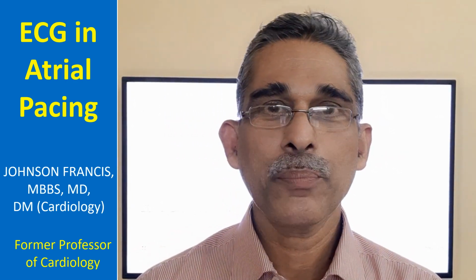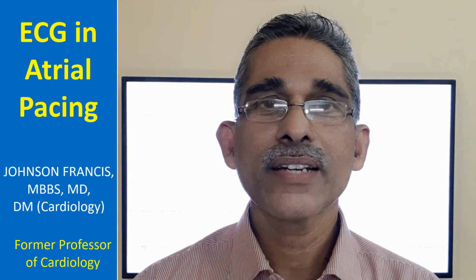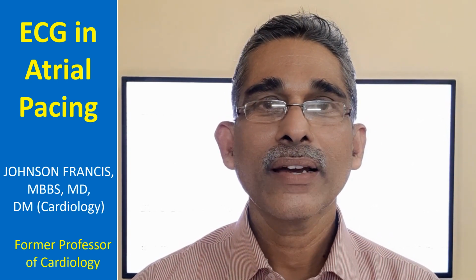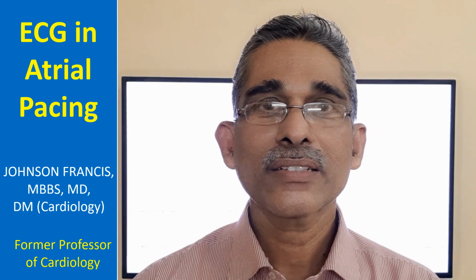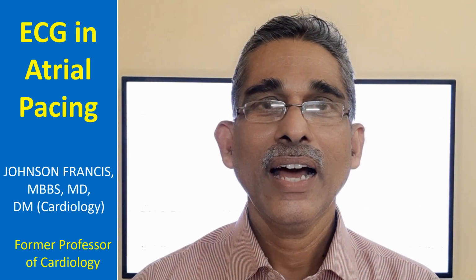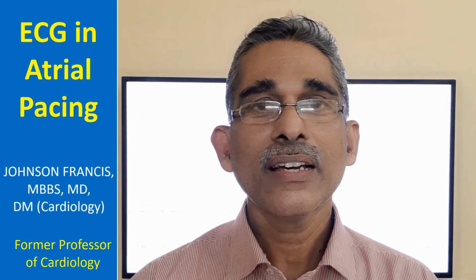Now I am going to demonstrate an ECG of atrial pacing. Atrial pacing may be done either along with dual chamber pacing or, very occasionally, as isolated atrial pacing when, in cases of sinus node dysfunction, AV node conduction is demonstrated to be perfectly normal. The advantage of using atrial pacing alone in such situations is that it avoids ventricular pacing.